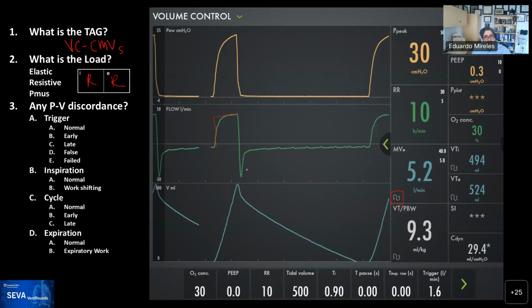Rob, comments? Sometimes people get confused. Well, why do you have a high peak expiratory flow and then a real slow expiratory flow at the end? So why isn't that a nice, smooth exponential curve? And the reason is that that high peak flow is associated with a very small volume, right?